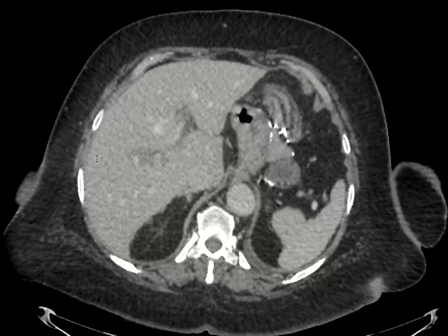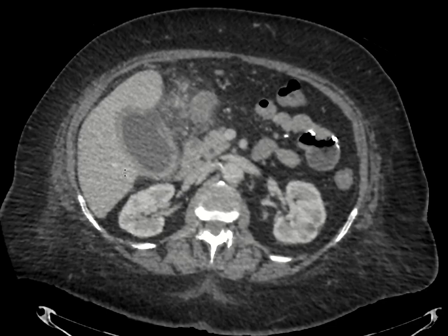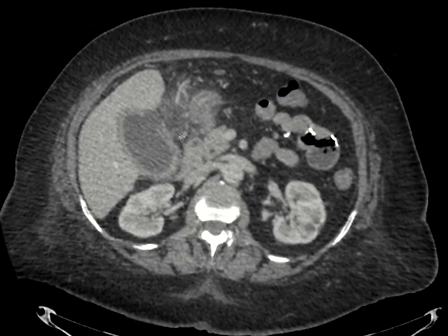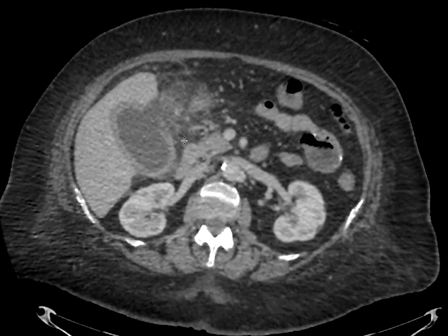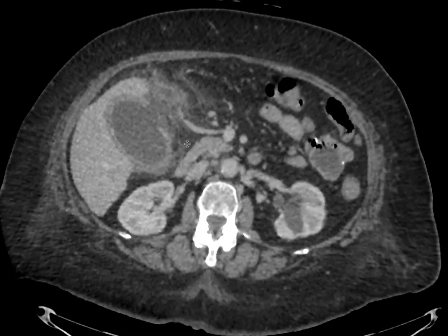This is a patient who is complaining of right upper quadrant pain, and we can see that when we look at the right upper quadrant, there's a lot of inflammatory changes in the fat. When we look at the left, you can see nice, clean looking fat, but when we get to the right upper quadrant, you can see these linear areas of soft tissue or fluid attenuation within the fat, and so this indicates usually inflammation.